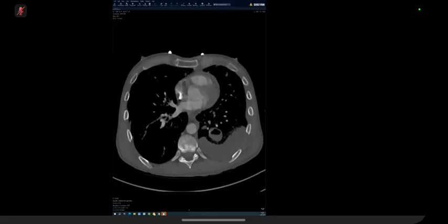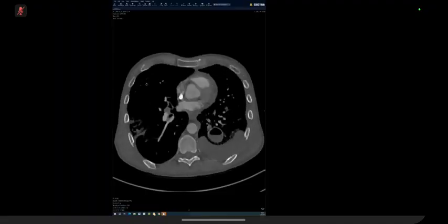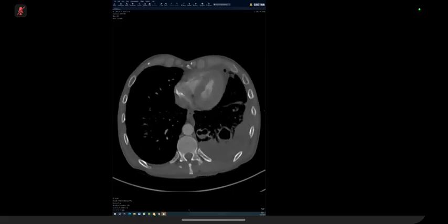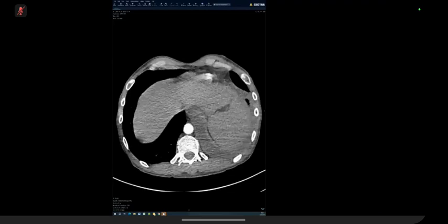To be honest, I am not accustomed to evaluating endocarditis on CT. But I can see that there are irregularities in the wall and the septum of the heart. So what's the test of choice to look for endocarditis?